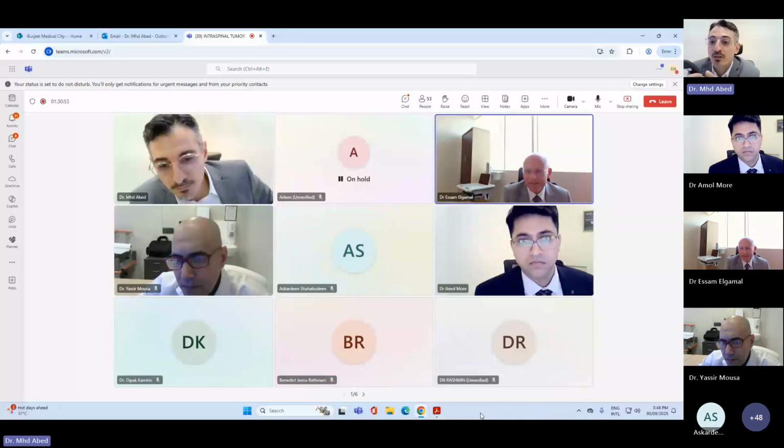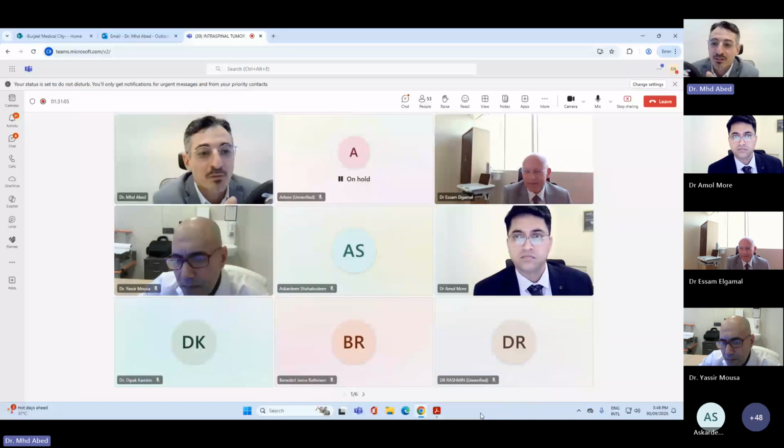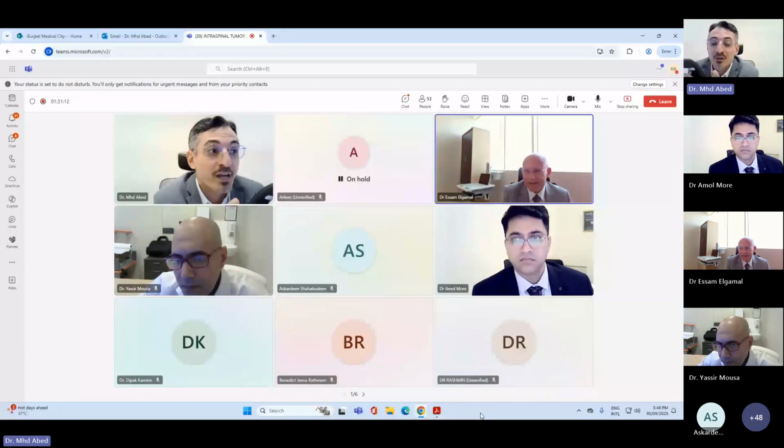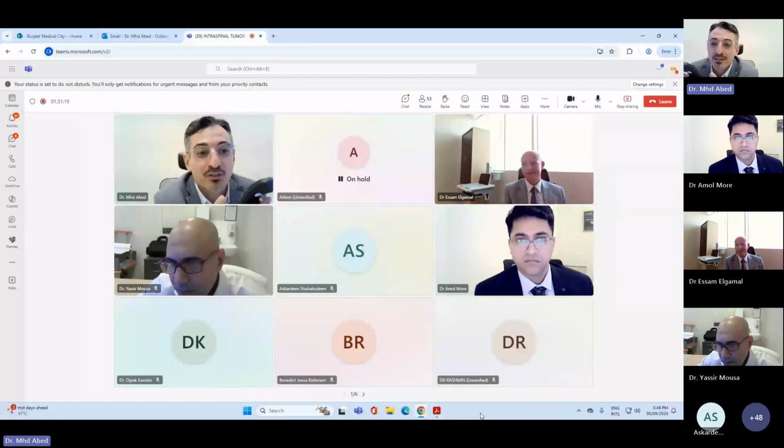If the lesion is extradural, we can see it, of course, in the CT. If we are dealing with enlargement or bone remodeling, we can see it better in the CT, of course. Only if it's extradural, but for intradural or intramedullary, there is no benefit. Or, for example, if we need to differentiate bleeding from calcification or ossification, because we had this case, Dr. Isam, which had this calcification. We thought it was bleeding, but it was calcification at the end. In such a case, yes, of course.